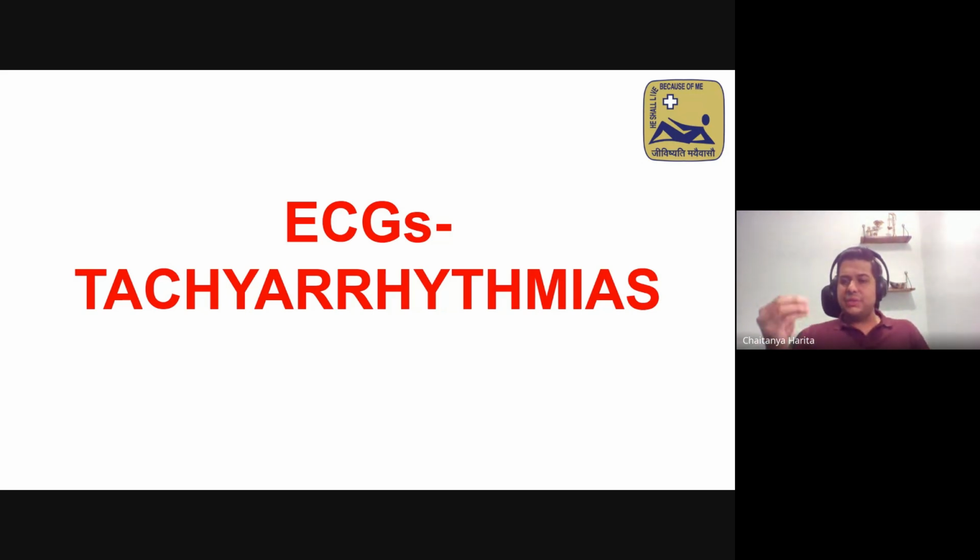Your key takeaways should be identifying ST elevation, identifying ST depression, and T wave inversion. So these are things you should unfortunately never miss in an ECG. If you err on the side of caution, I've had bonders who sent me ECGs where it's ST elevation, but it's 2 mm in a 25-year-old. 2 mm, but in V2, V3. Now I know that more than 2.5 is significant, right? Some of you may not know that yet.